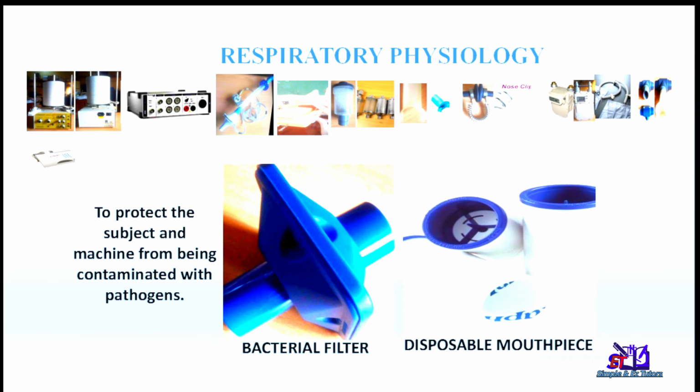These are accessory instruments normally attached to the Vitalograph. This is the bacterial filter that helps to protect the subject and the machine from being contaminated with pathogens. This is a disposable mouthpiece. It has a rubber diaphragm inside, a one-way valve inside. It can be used in the absence of a bacterial filter, and it's disposable.